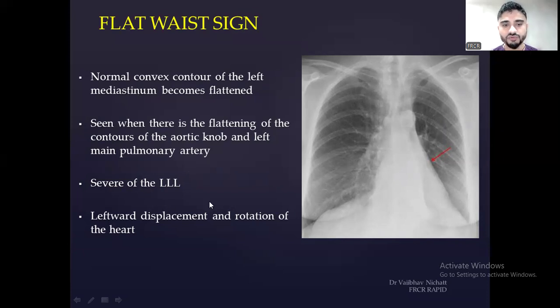There is leftward displacement and rotation of the heart. So the heart might be displaced to the left side, seen in severe cases of left lower lobe collapse.